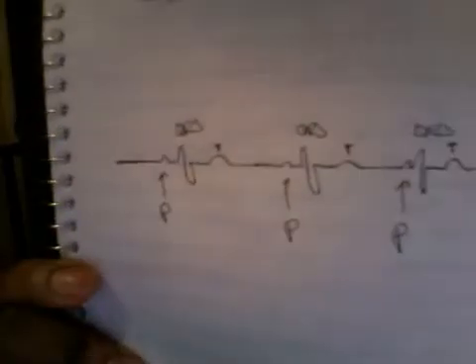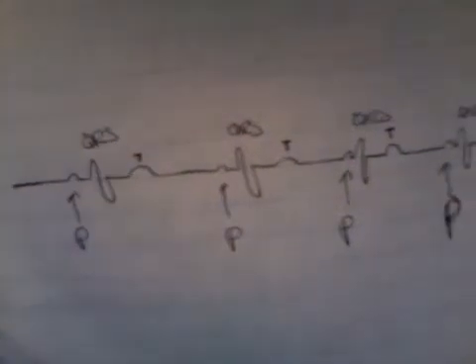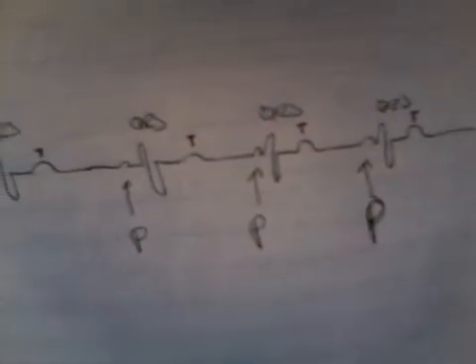Okay, so now I have my version of EKG. If you know anything about heart rate, you know that this person is sick. Something wrong going on here. But for all those who don't understand, I think this might look backwards. I hope it doesn't look backwards for you.